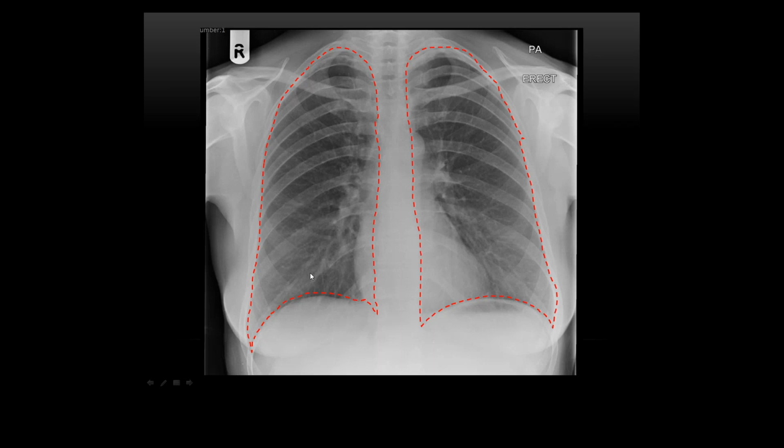One area that can be quite tricky, which you may have come across, is this right lower zone, because you get this confluence of vessels that come down. Now with chest x-rays, because we do all chest x-rays erect, just because of gravity, blood always travels down into the lower lobes first. So you get this confluence of vessels that are usually a lot more engorged. So it can sometimes mimic consolidation. It can be really difficult, if the patient's rotated and we've got these engorged vessels, to say that there is definitely no infection there. So we might do a follow-up on that one.